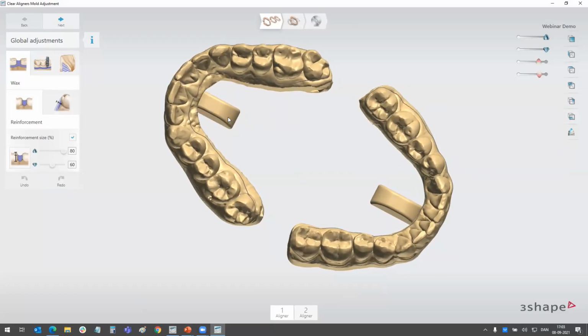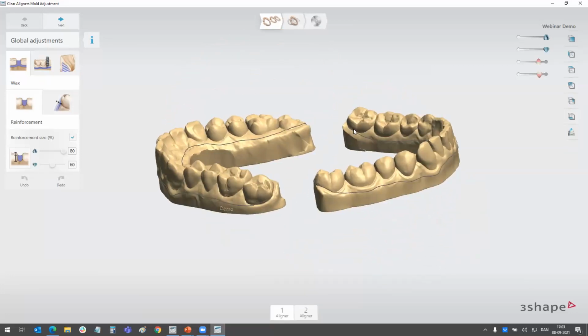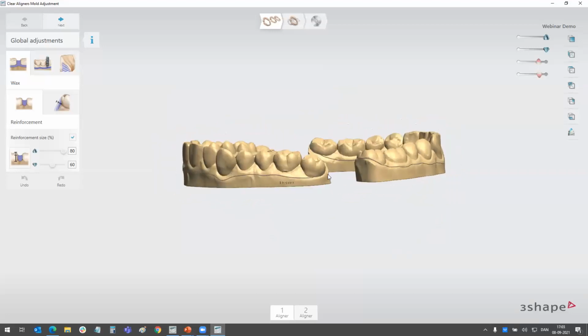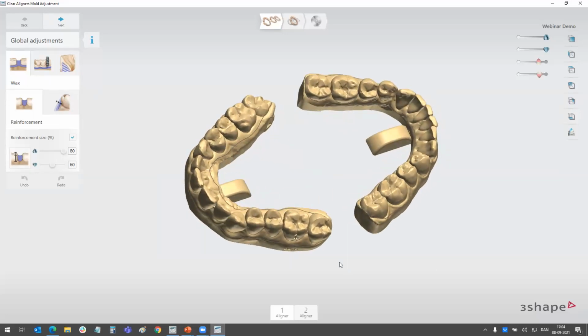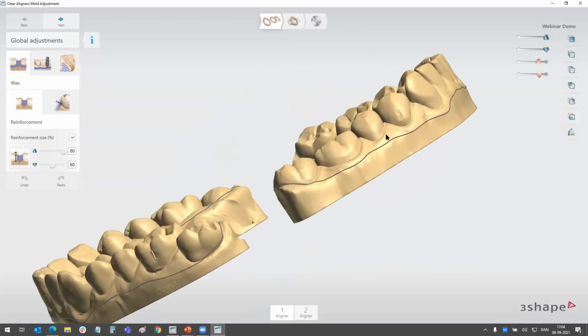You might have noticed these bulges here. This is called a fixture. This is not a real fixture, just a dummy fixture we have made. This new version of the software will allow labs to auto-generate a cut line where you could then have a milling machine cut out the aligner automatically. We typically see that it's only very large labs with very high volumes that want to invest in this kind of workflow. But we have enabled this functionality, and I will turn it on just so you can see it.